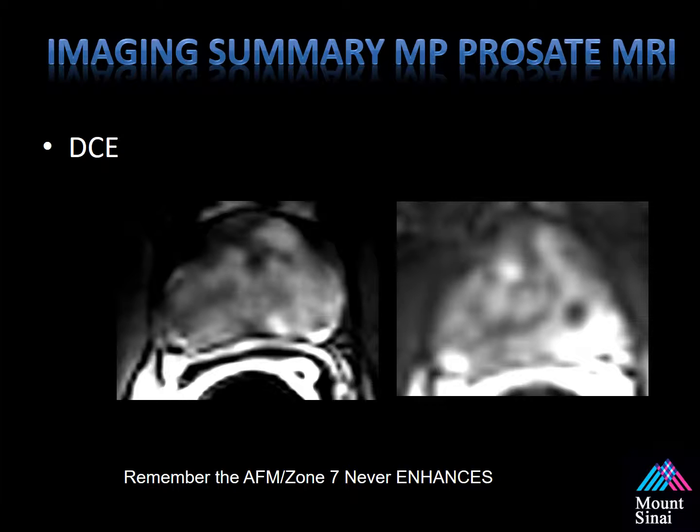Also, since it's very fibrous tissue, on ultrasound it shows up to be part of the prostate. But when you do your segmentation of the MRI, you may look at this and skip this because it doesn't have that bright signal associated with the peripheral zone or the central gland. So be aware that your segmentation errors can occur if you're not paying attention to whether the anterior fibromuscular stroma is included in your prostate MRI segmentation. I'll be going over that in a different talk.